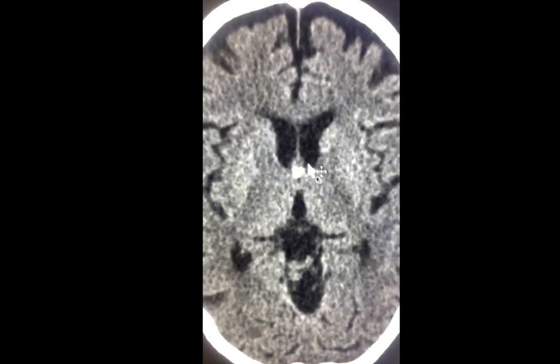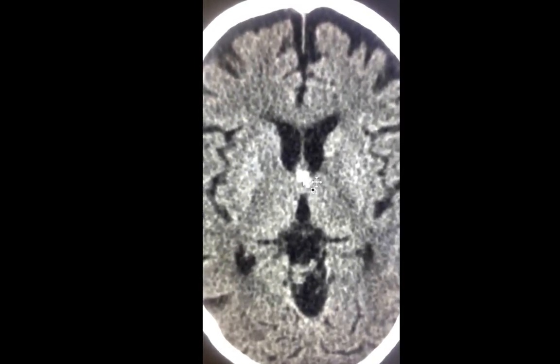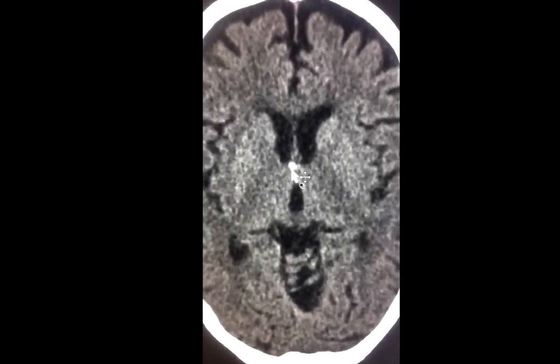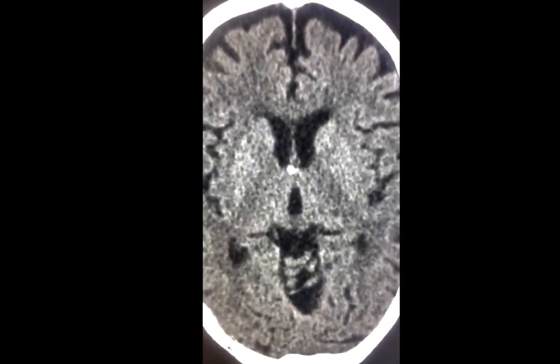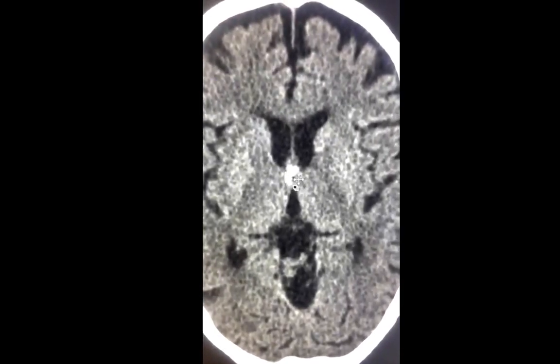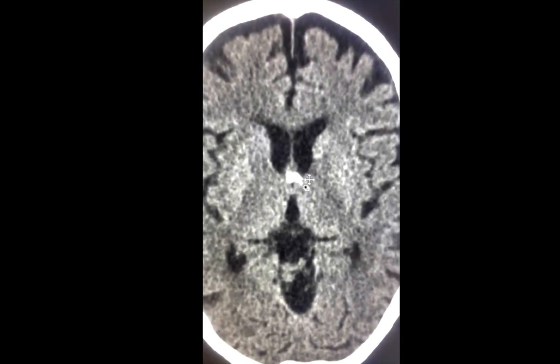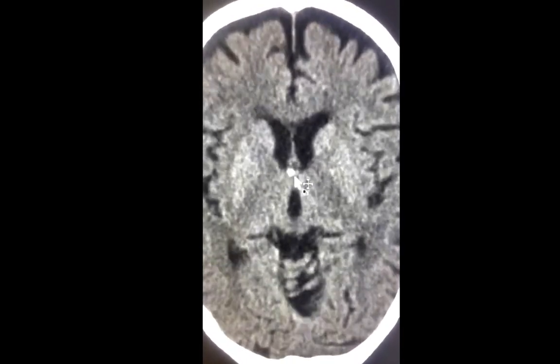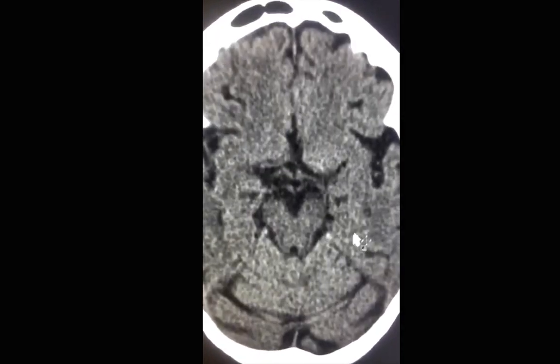For the junior follower, we learned before that high density on non-contrast CT could be calcium or hemorrhage. The density of this area is less than that expected for calcium, especially if you compare that to bone. The fact that this is isolated in this location and hanging there would be very unusual for free-flowing hemorrhage. If this was indeed intraventricular hemorrhage, you'd expect to see hemorrhage dropping elsewhere within the ventricles, especially in the dependent locations.